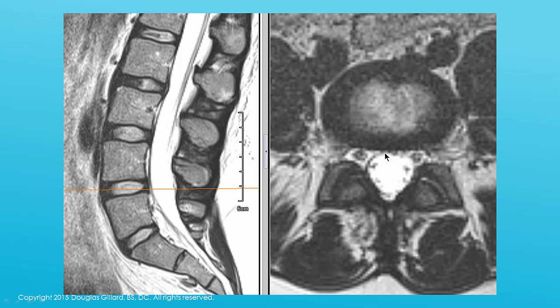Now here, remember, there's no spinal cord way down here, right? You have a dural sac, which the cauda equina hangs in. You can actually see the lumbar nerve roots. These are the exiting. These are, let's see, this is the L4 disc. So these are the L5 traversing nerve roots. These are going to go down and exit below. And these are the S1 roots here. And then out in here, these are the traversing L4 nerve roots out here, right there. They're already out and exiting. So we'll get into all that.